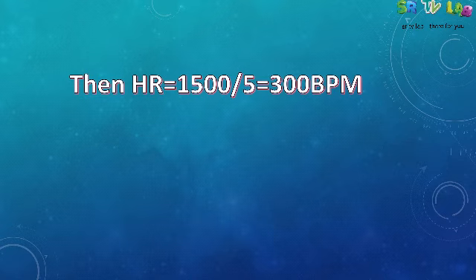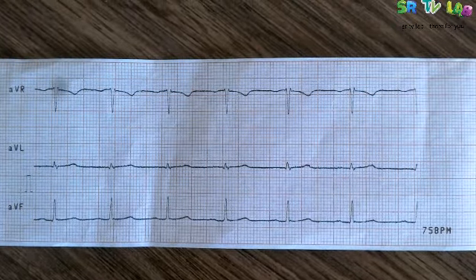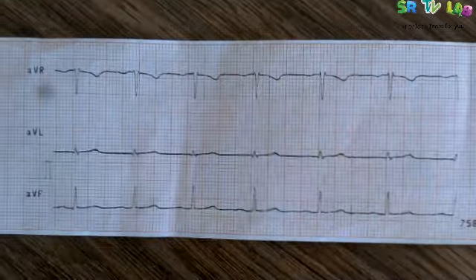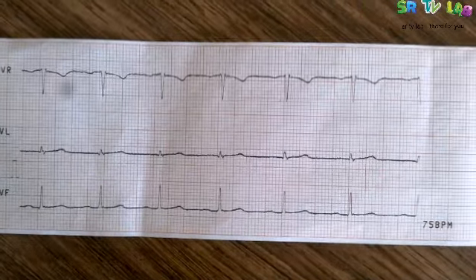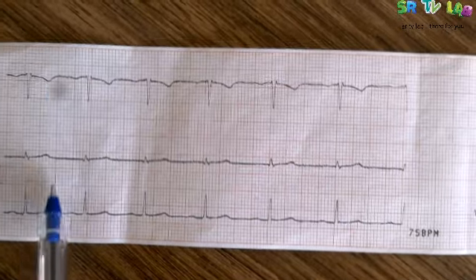Do you get me? So we are going to use the real ECG paper or electrocardiogram with the heart tracing on it in order to know it very clearly, so that it will be easier for you next time to calculate the heart rate. So guys, this is how the ECG paper or electrocardiogram looks like. Good. Let's come back here.